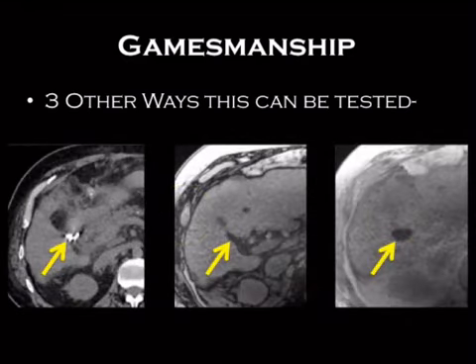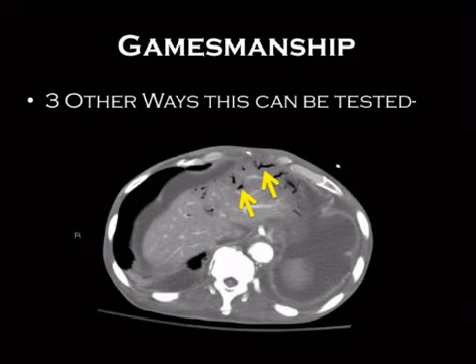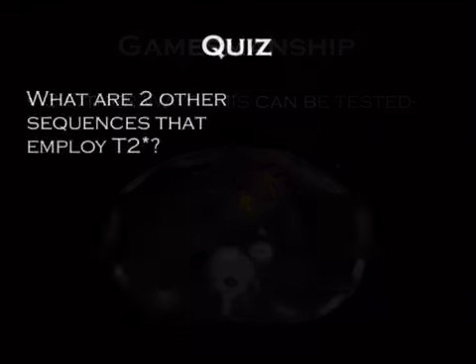You can do the same thing with clips. You could write a question where they show the blooming getting progressively worse, and they sort of cone in on it to make sure that you couldn't see the dark line artifact, just showing you that blooming is getting progressively worse, and asking which of the following was obtained first. Blooming gets worse, so the less blooming is obtained first, the worse blooming is obtained second, because of that T2 star effect. Air anywhere, including in the liver, you could do it like that too.